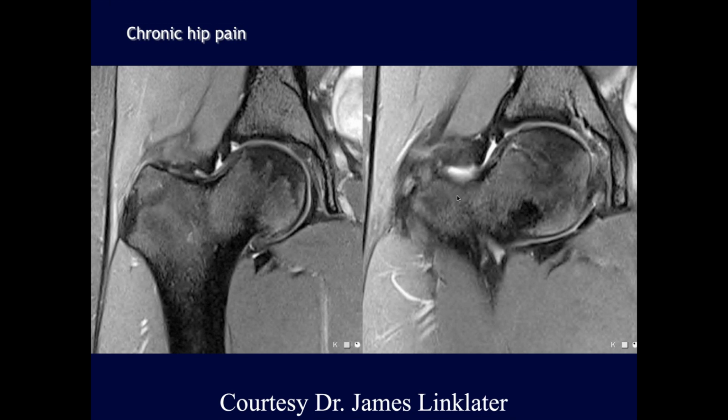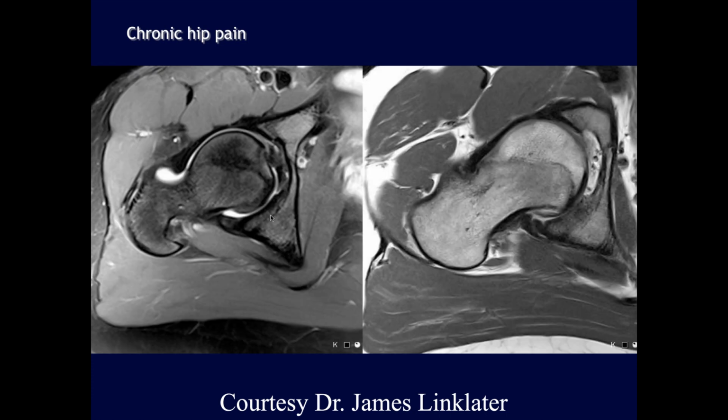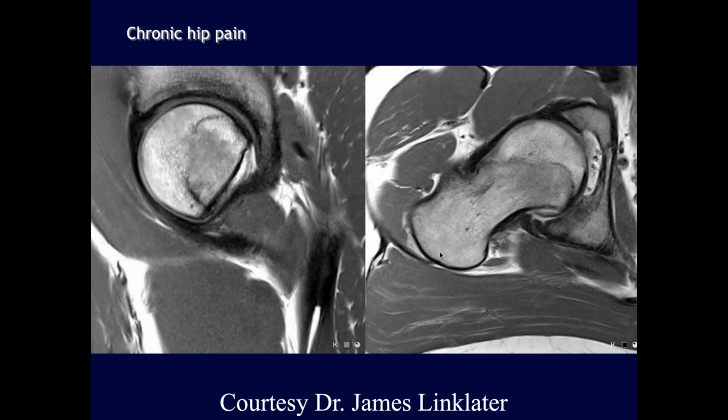So I'm thinking they might have had a SCFE and then it never got diagnosed or treated, and then it healed. Yeah, now if we look at the axial images, you can just see the femoral head is kind of dysmorphic, but the plate is pretty much closed. So I guess the SCFE basically healed on its own in an abnormal configuration. Right, exactly.